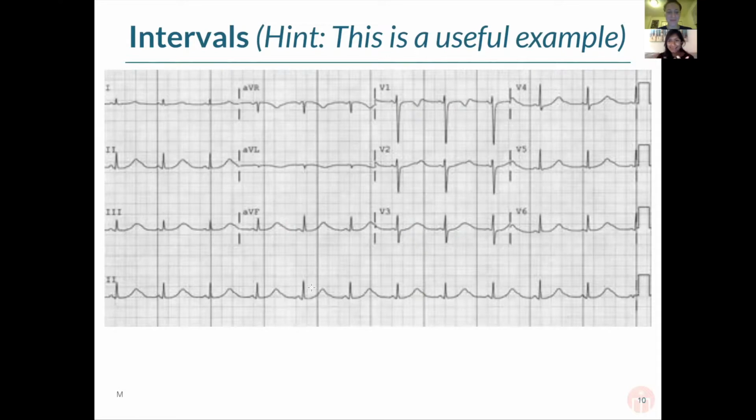So the next thing that we go through, so we went through rate, rhythm, axis, now we're at intervals. And so there are a number of intervals to look for on every single EKG. There are a few that you need to know for Step 1.